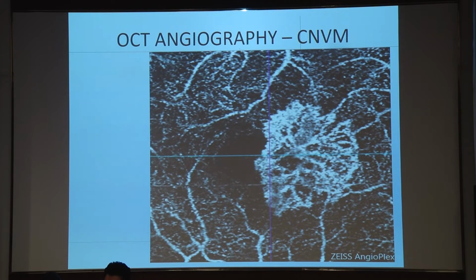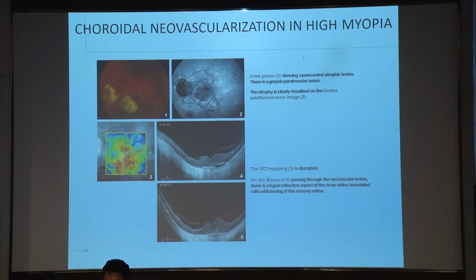And besides doing the OCT B scan and regular fundus imaging, we can see that the neovascular complex is reducing in size over the subsequent injections, and this is useful in treatment planning.